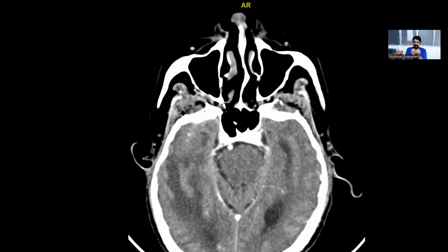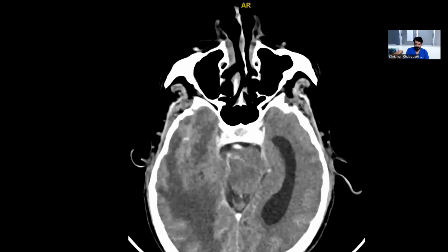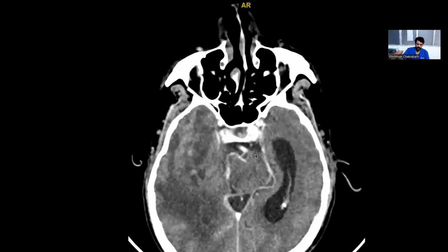Now, these cisterns are pictorially a differentiation between the brainstem and the temporal lobe. The texture of the two is also different. So let's go ahead and see. Here you are able to see that these cisterns, like this is the midbrain, are basically gone. There is no cistern here. That is because the CSF has been displaced because of mechanical movement of the temporal lobe crushing the brainstem.